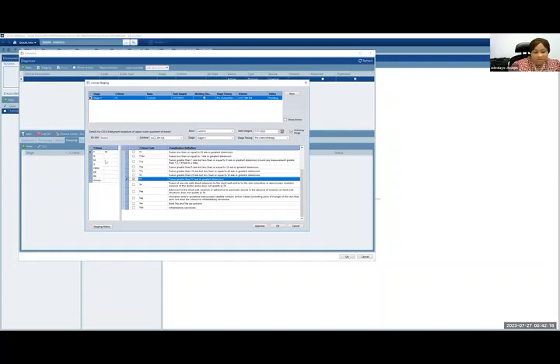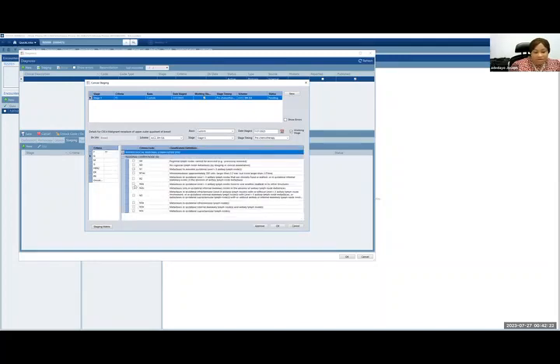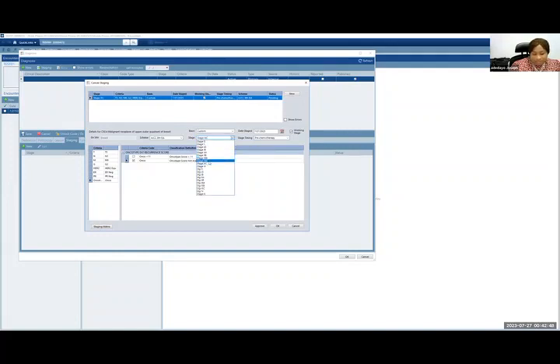So we're still going to fill in a T3, still going to fill in a clinical N3, we said. We're still going to fill in an M0, grade 2, HER2 equivocal, ER negative, PR negative, Oncotype score not evaluated. And then based on all this, because we've used anatomical staging for this patient, we will stage her as a 3C, for example, or just as a stage 3B.